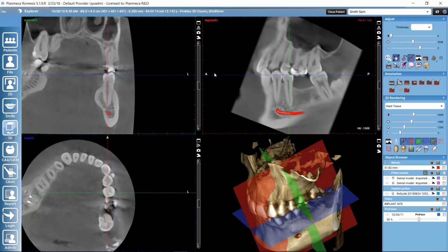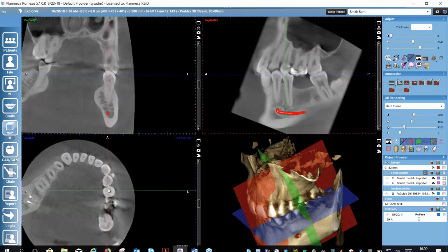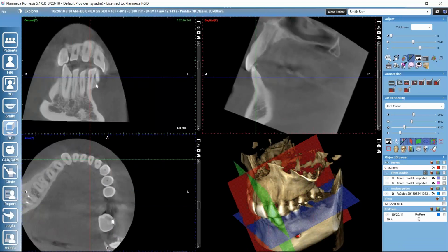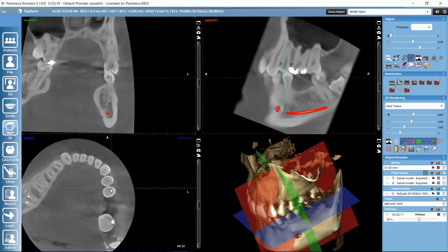And like I said, another option is to move these cross sections instead. So if we deactivate this move rotate volume, we can actually grab the cross section of the planes, and we can click that to any point of interest in the volume, or we can just move it around.